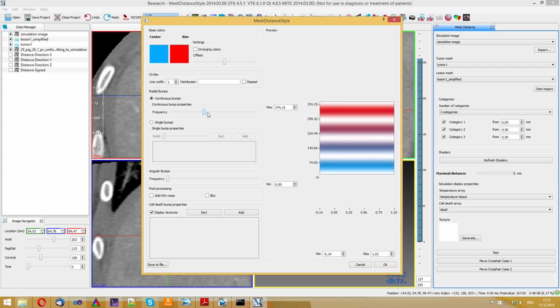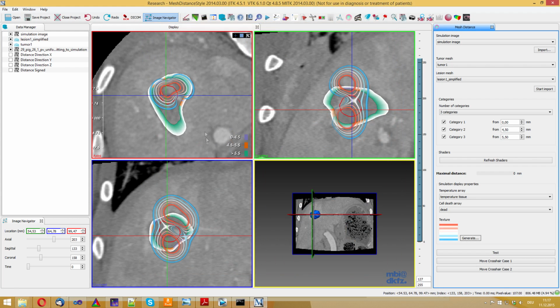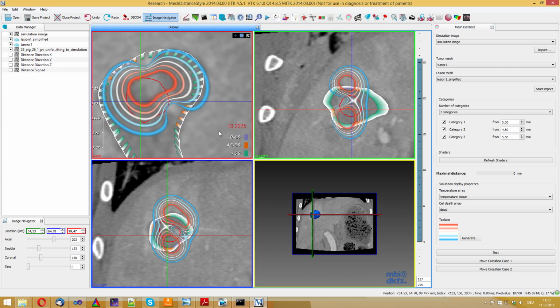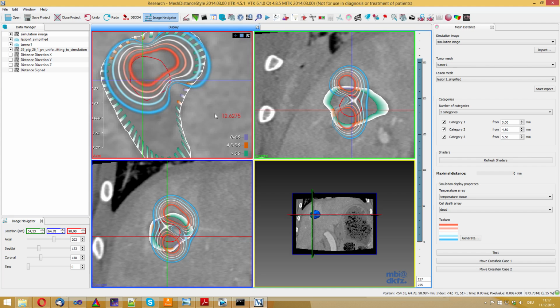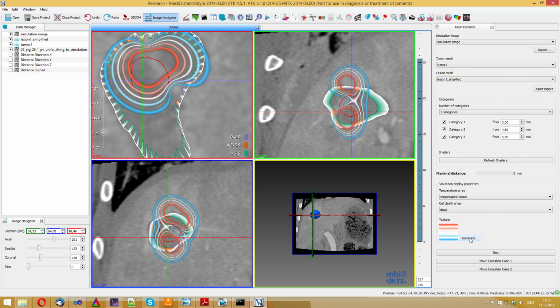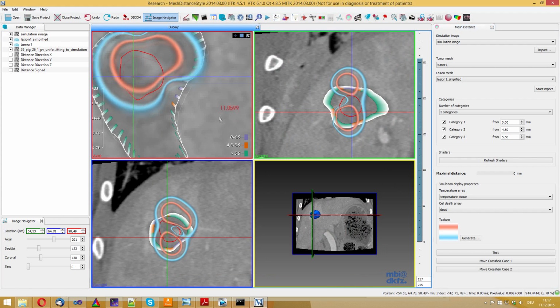We exploit a highly configurable isocontour-based color coding approach. One possible configuration provides an overview mode which equally subdivides the data into multiple ranges. We do not only encode the ISO value, but also provide information about the steepness of the gradient around the ISO contour. We fade out the opacity of the representation based on the value range of the desired contour. Thereby, ISO values embedded within a low gradient result in a wider contour in our visualization.